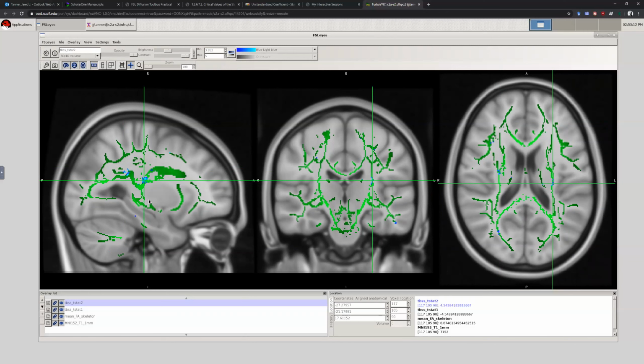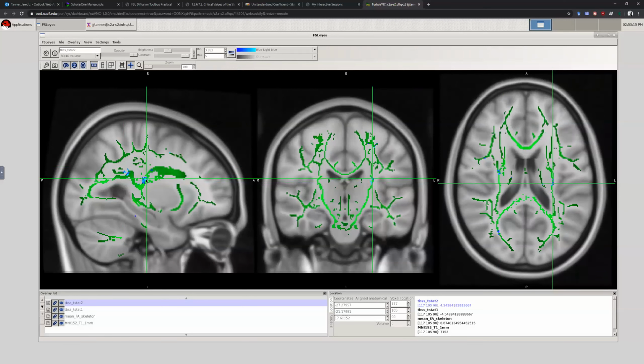So we're just seeing a group difference here. And so those are some results that we might be reasonably comfortable with. And so we're seeing some differences here in white matter, what we said near the sort of part of our cortical spinal tract.